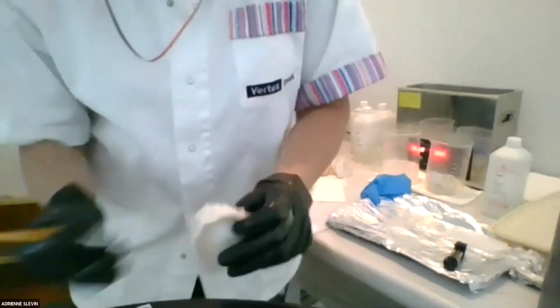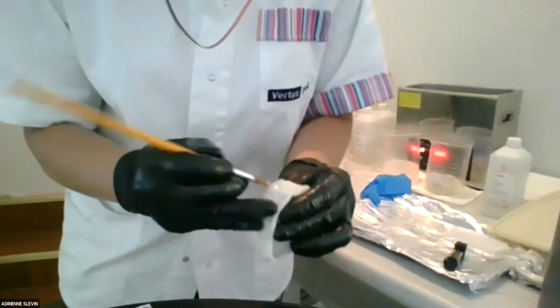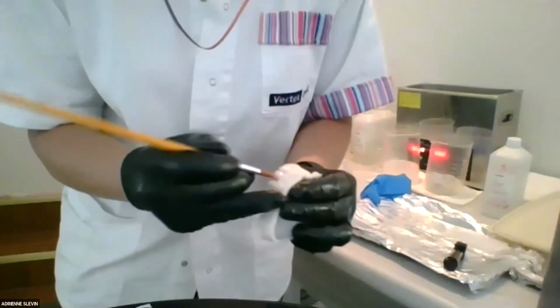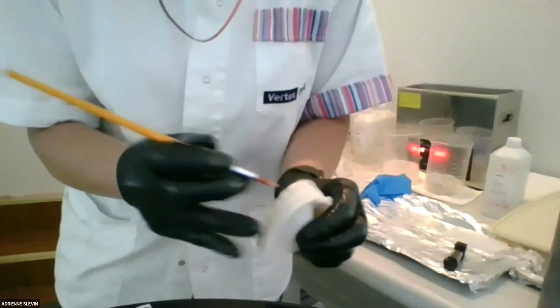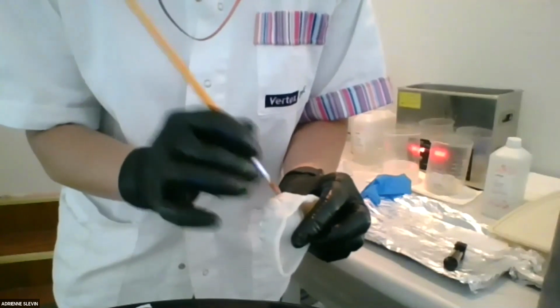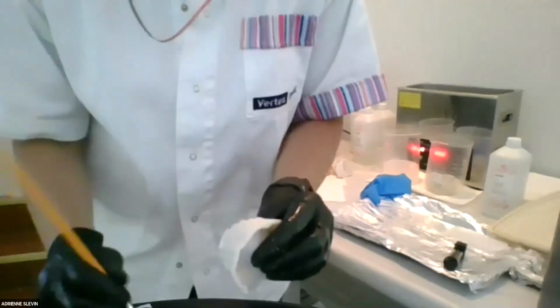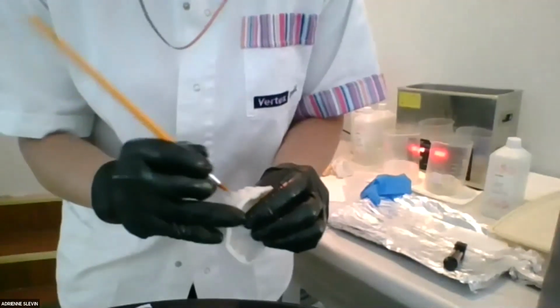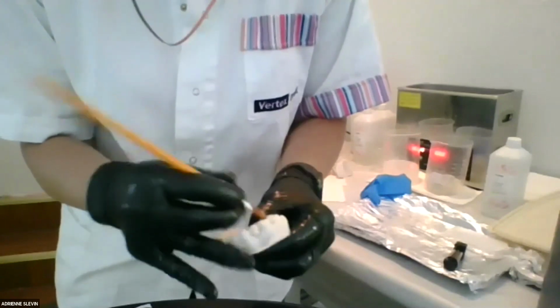And so before I put it in my oven, I don't recommend doing this for any biocompatible parts, but I'm just gonna brush a little resin here, nice thin layer. And then when it comes out, it's gonna be super shiny and I don't have to polish it before I make my matrix or send it to the doctor. Like a lot of times, you know, on your traditional wax ups, you would use floor wax or something like that.